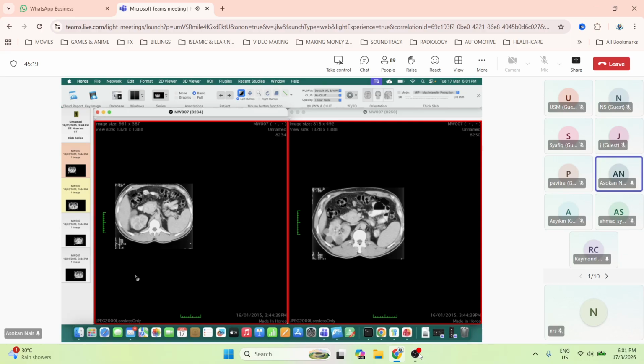So remember the exam, some of them are like this. They are part of a syndrome. So it must click in your mind straight away, right? You're saying metastasis from the left kidney renal cell carcinoma to the pancreas, which is such a rare thing, and you forgot that the other kidney also shows lesions. So you must already start thinking, can this be part of a syndrome? All right.